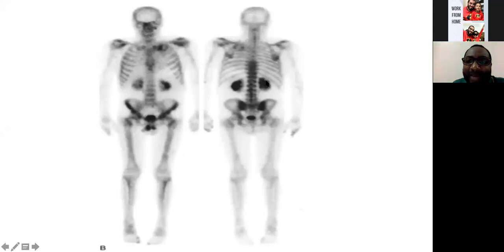And if you look at it, the cortex is a bit irregular. So it's probably some obstructive uropathy. Another question you need to emphasize.